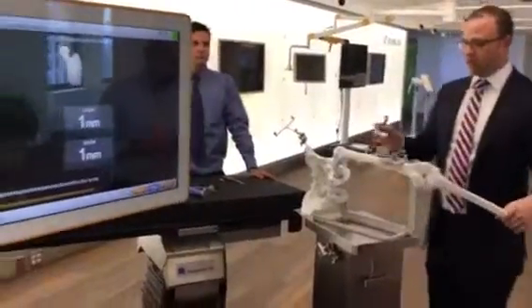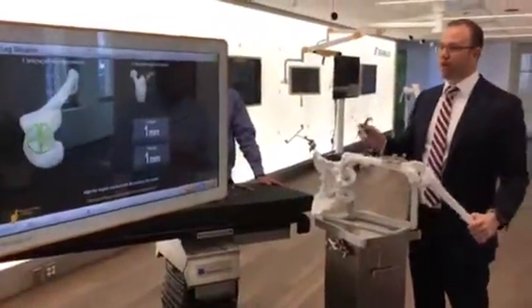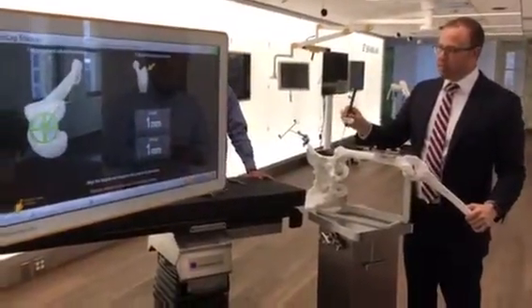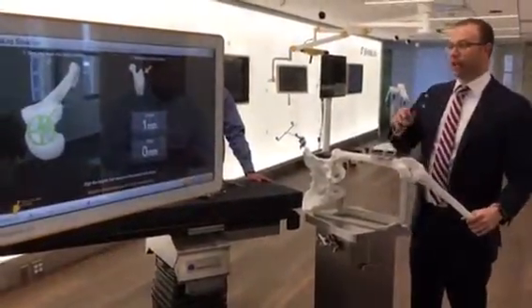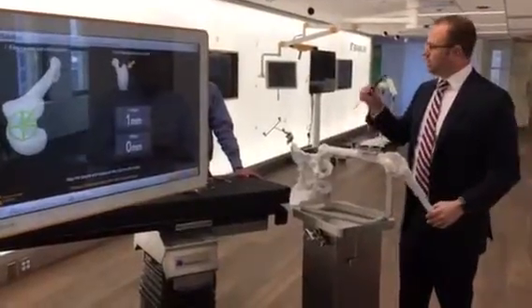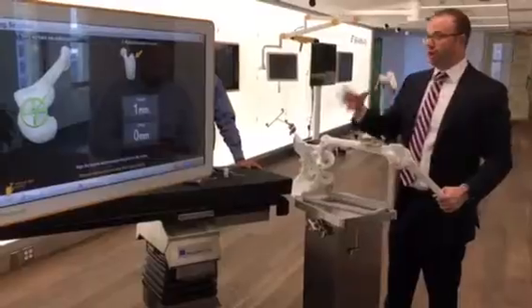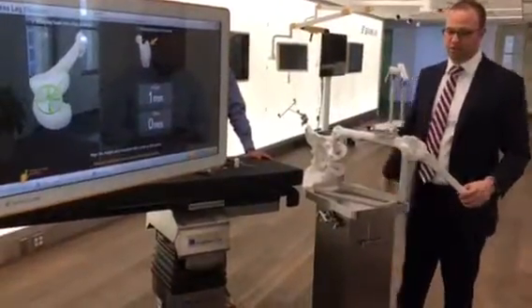We're not comparing it to the contralateral. We can use an x-ray from a pre-op image to tell us what has happened to this case. So pretty simple, a handful of points. Registration is really dialed back and intended to make this a really clean procedure where you know your cup version and your leg length change over a case.